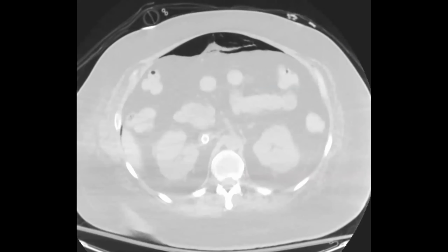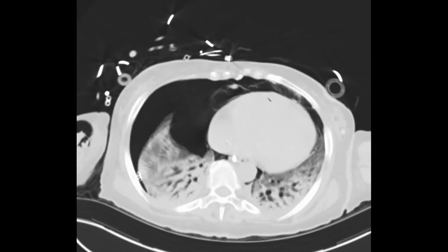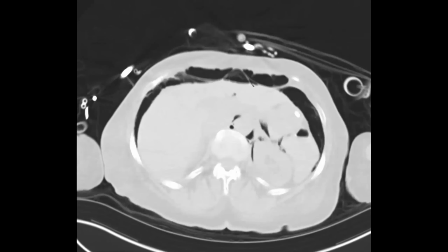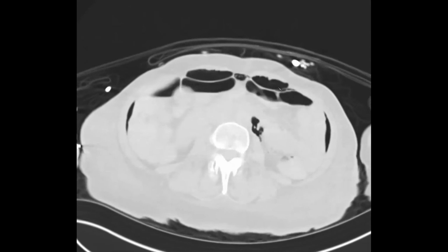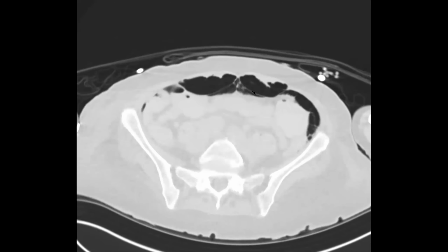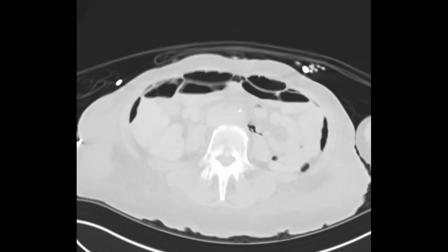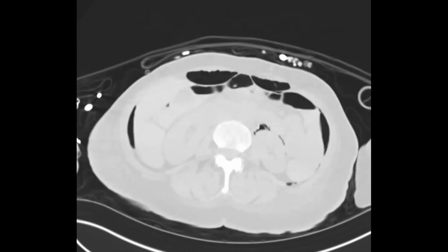And I actually have a second case where the same thing happened. In this case, this patient also had barotrauma, lots of pneumomediastinum. And then you can see that it's basically in the rectus sheath, and then posterior to the rectus sheath, but not into the peritoneal cavity. So here we can see that's basically the rectus sheath and transversalis fascia. This is the peritoneal lining. There's air here, and there's also air between the rectus muscle and the rectus sheath. So it's not that clinically relevant, but you wouldn't call it free peritoneal air.